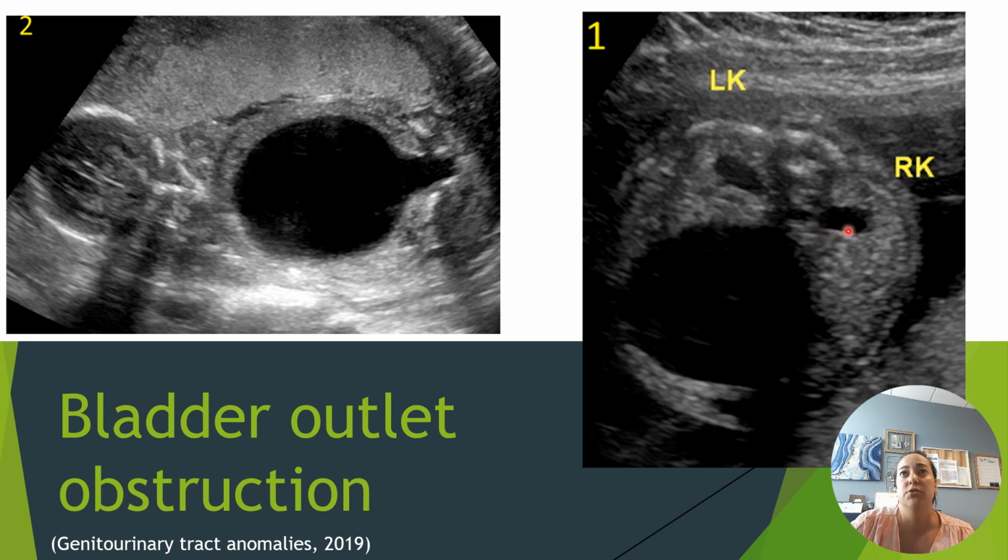Here is an example showing bilateral pyelectasis or hydronephrosis, as well as an enlarged bladder. So two different examples there.